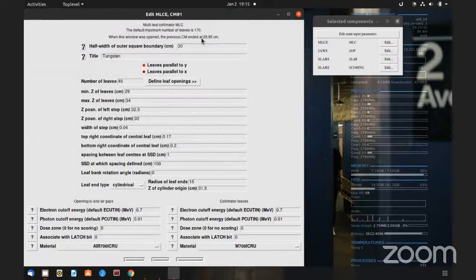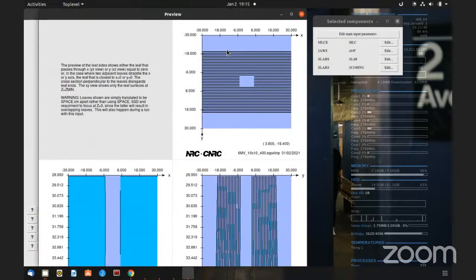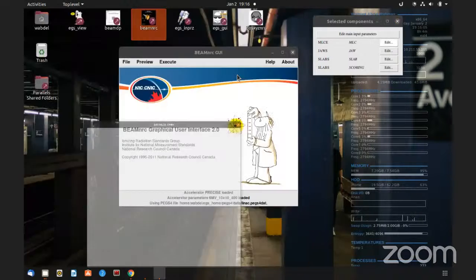Because here, the way this looks like, you have this open. If I look at the beams preview and preview here, okay, this is the opening of the MLCs. Yes, sir, at minus. I'm trying to think why this is distance. Okay, let's open. Let's look at this again.